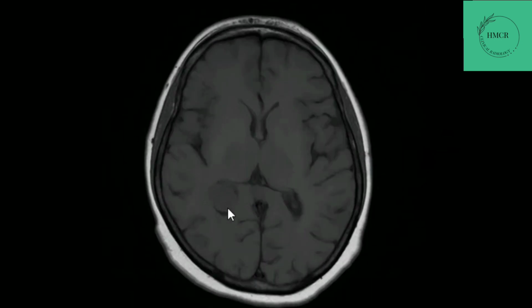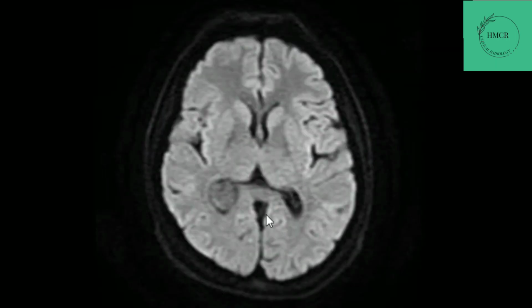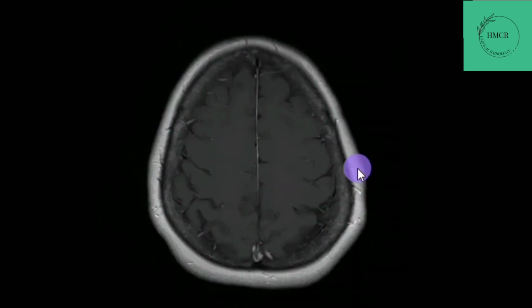and the lesion is showing isointense signals as compared to gray matter. This is the DWI sequence, and the lesion is not showing any hyperintensity. This is the ADC sequence, and the lesion is not showing any corresponding hypointensity. This is the SWI sequence, and the lesion is not showing any significant signal dropout.